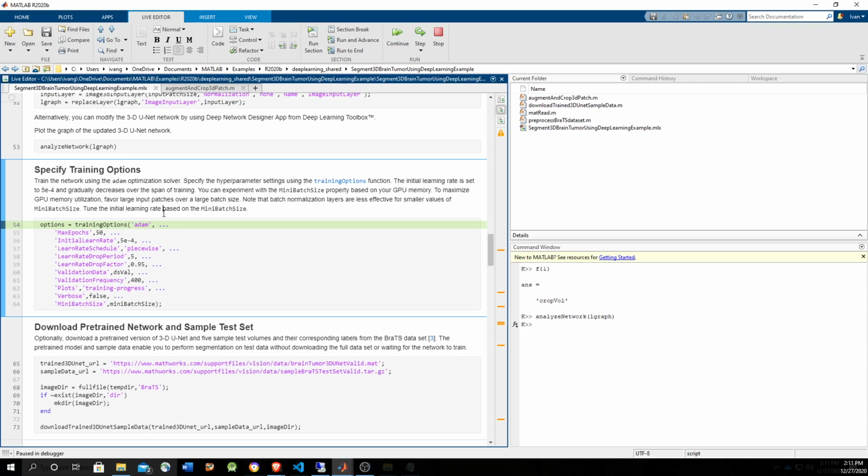At the beginning, the update is gonna be very high, and eventually the update is gonna be lower towards the end. So we start with this initial learning rate, and as the training progresses, it's gonna drop down by this factor, the learning rate, to make it slower. Each 5 epochs is gonna drop down the learning rate to make it slower as the training progresses. Because at the beginning you expect to have a bunch of errors, so that's why you want to learn faster at the beginning. But then towards the end, as it gets more stable and close to the solution, you want to learn slower.